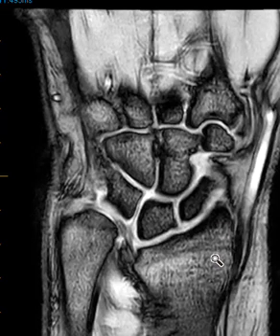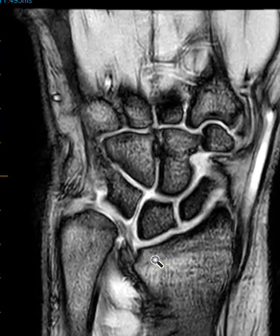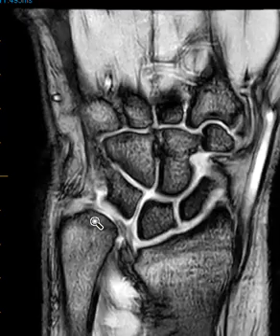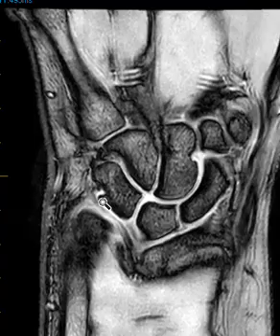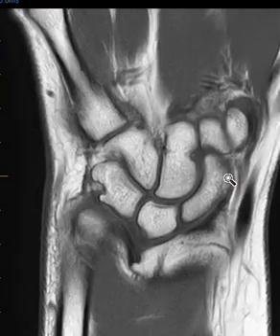And so to recap, Madelung deformity is premature closure or limited development along the ulnar aspect of the distal radius. It causes this ulnar tilting of the distal radial articular surface, and also palmar tilting. And because it's short, we get the ulnar positive variance and impaction or abutment with the triquetral bone, and we get the proximal migration of the carpal bones and this funny V-shaped configuration of the proximal carpal row. Again, it's typically autosomal dominant, but can be acquired, and it's bilateral in between 50 and 70% of cases. And that's it, Madelung deformity of the wrist and forearm.